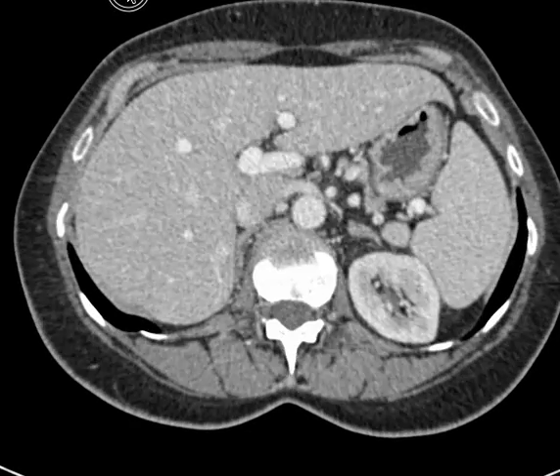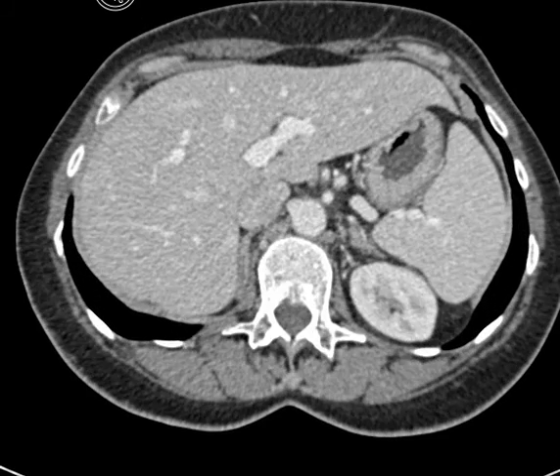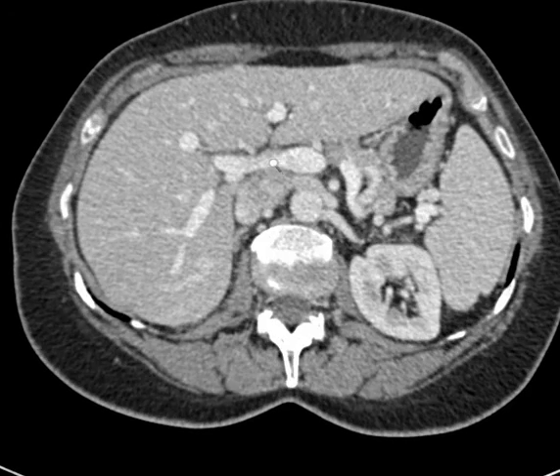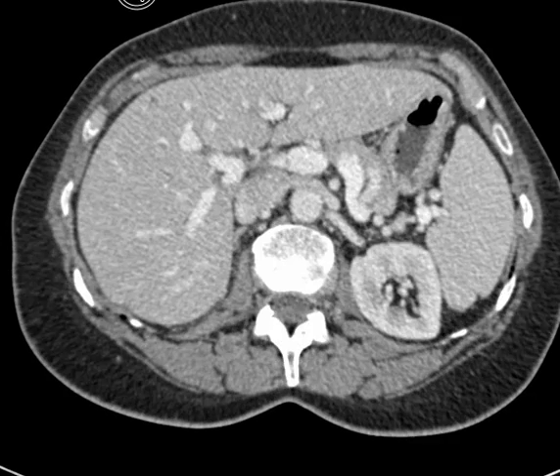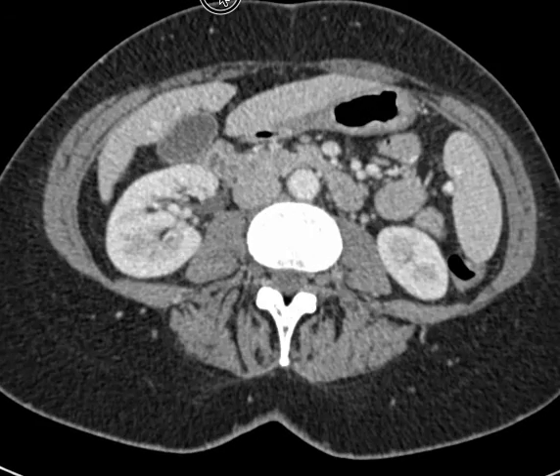And then there's also portal veins. So here's a portal vein coming into the liver. And the liver is a little bit unusual in that a vein brings blood into it along with an artery. The artery is always much smaller. I shouldn't say always, but at least in the normal person. So here is that portal vein, and it's going to branch in most people into a left portal, which is right here. So this left portal, you can see it, and then a right portal. So this is the right portal. So that's a little bit of a look at the liver anatomy.